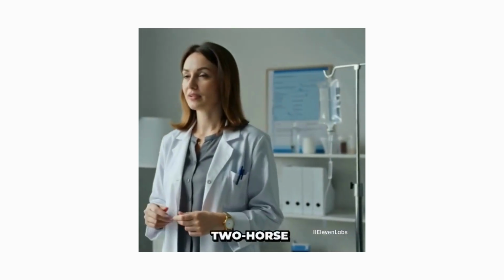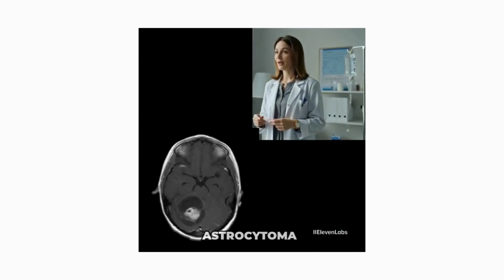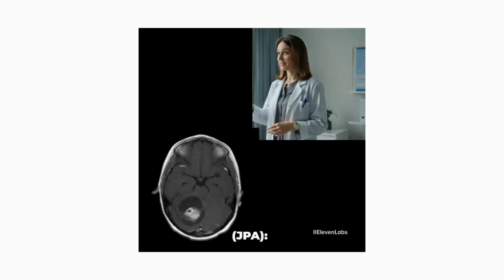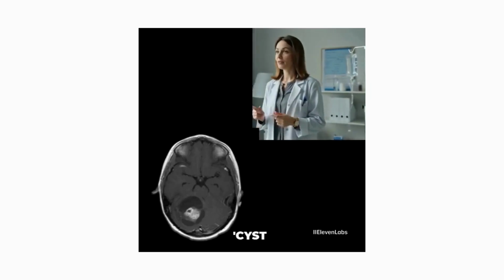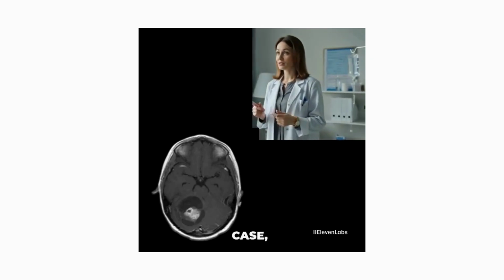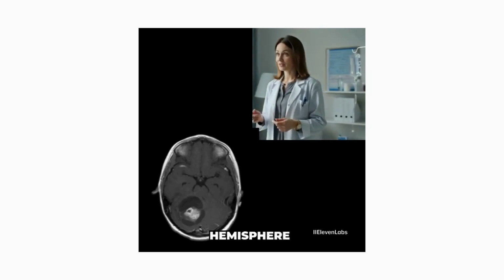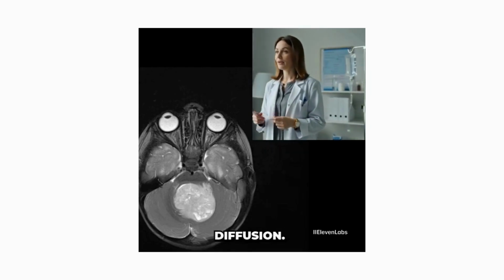It's not always a two-horse race. We must consider the mimics. Juvenile pilocytic astrocytoma, JPA. Look for the classic cyst with an enhancing mural nodule. Unlike our mystery case, JPA is usually more lateral in the cerebellar hemisphere and lacks restricted diffusion.